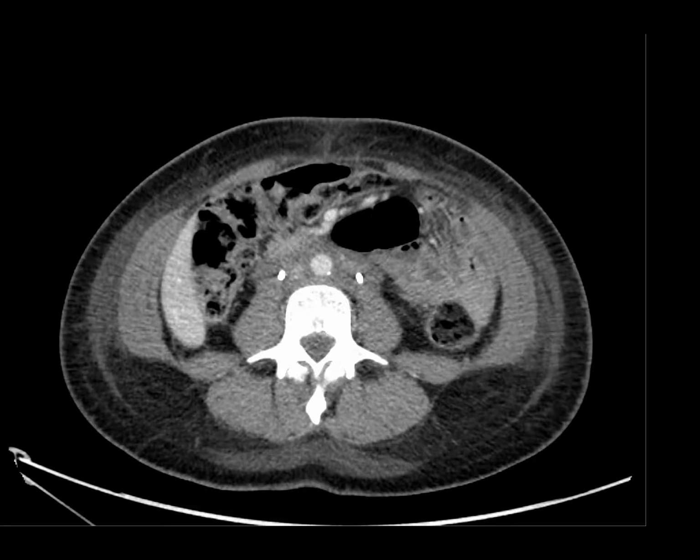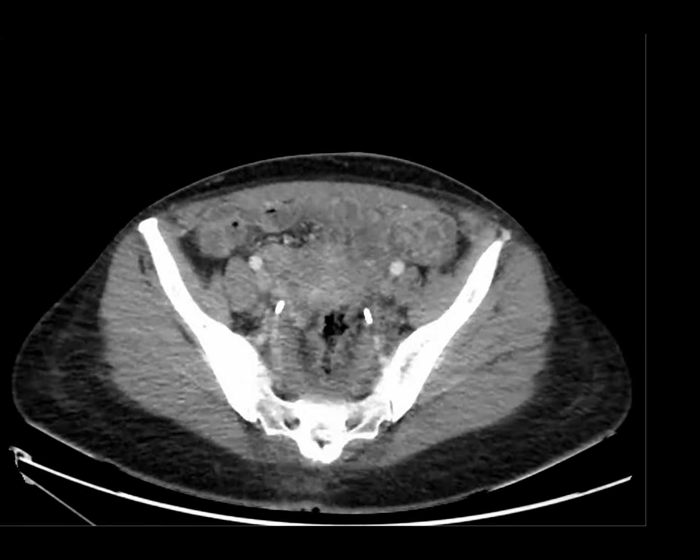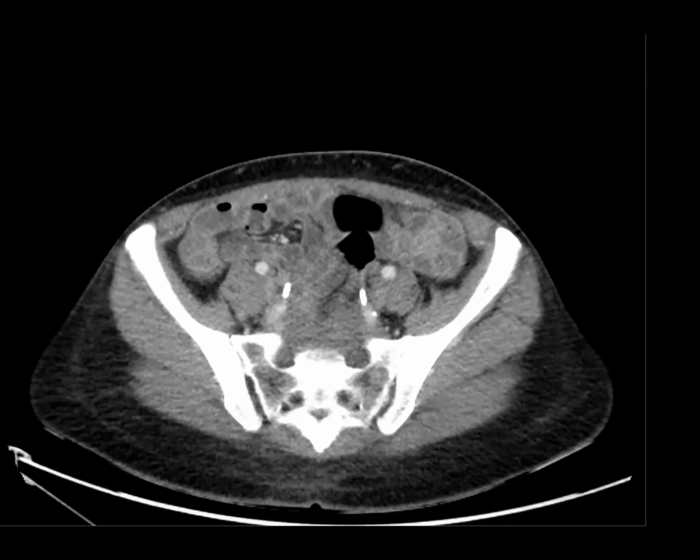But I'm just not a pathologist. It's going along the entire course of the vessels all the way down. You know, it's just not the behavior of a desmoid. Yeah. I don't know. It was biopsied multiple times and they discussed it extensively.